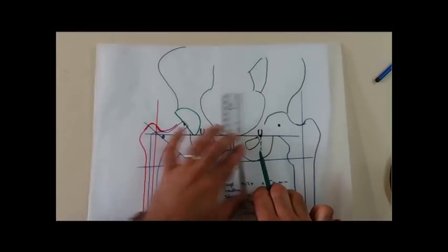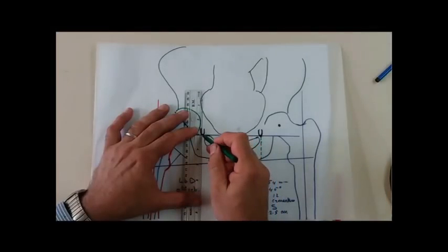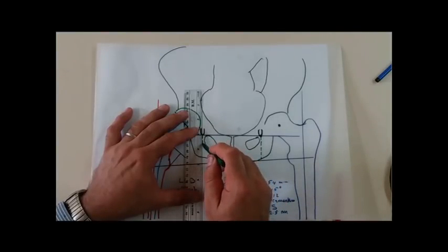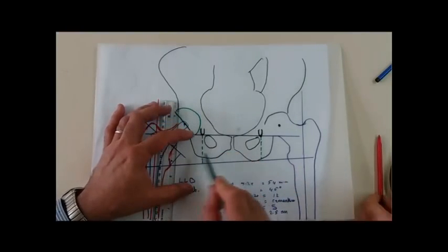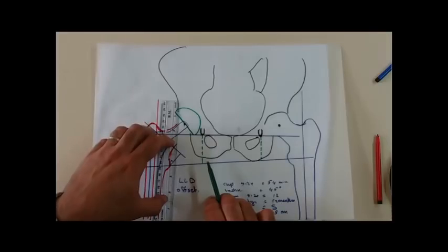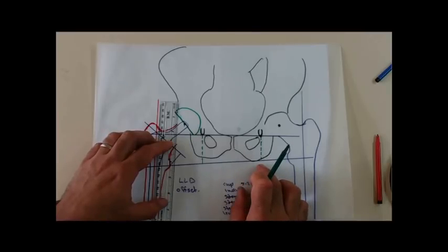Also doing the same for the abnormal hip. Draw a perpendicular line from the teardrop to the interlesser trochanter line, and we can measure these two figures. If there is an unacceptable limb length discrepancy, I should manipulate my whole templating. If it is within acceptable limits, that's to say shortening of half a cm is acceptable.